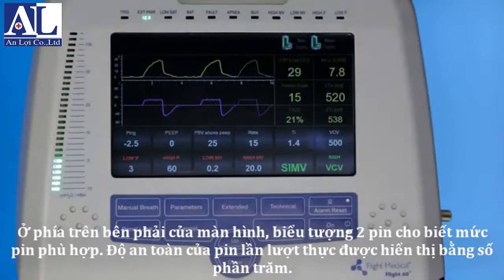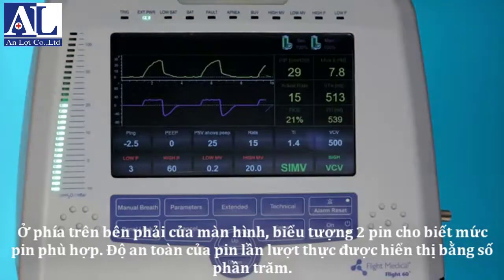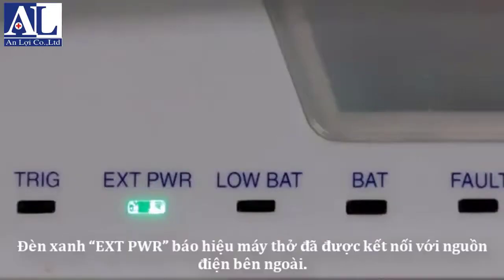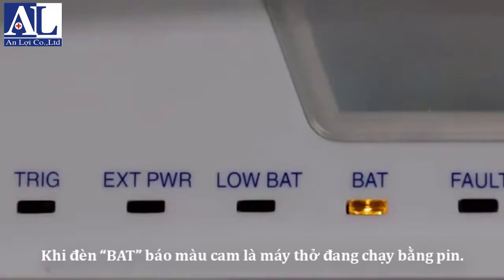On the top right hand of the screen, the 2 battery icons indicate the battery's capacity. The real-time battery capacity is displayed in numeric percentages. A green battery LED indicates that the ventilator is connected to an external power source, while an orange LED indicates that the ventilator is running on battery.